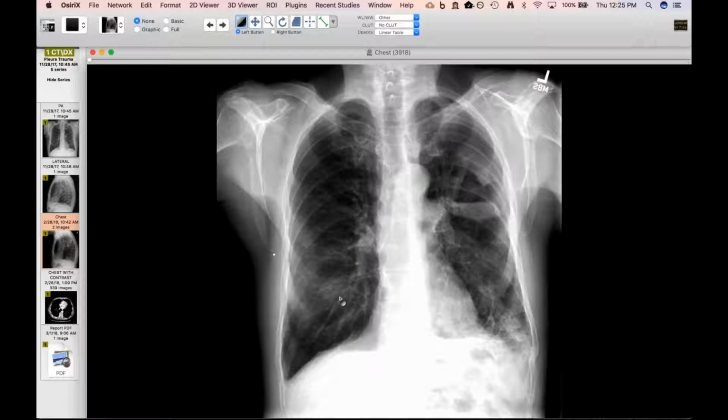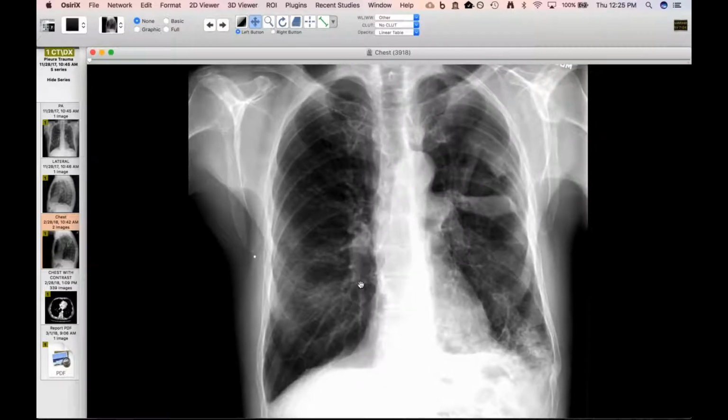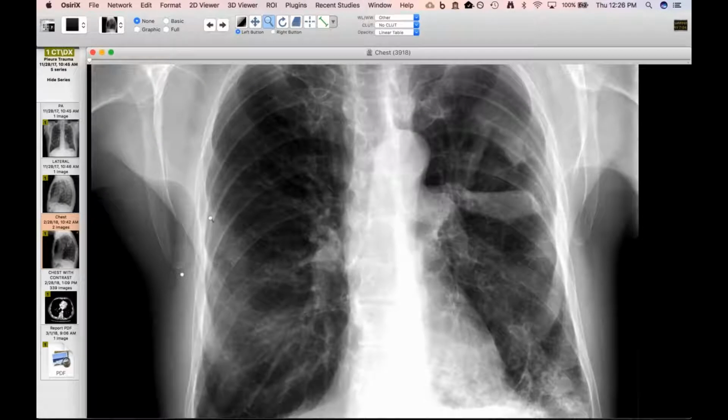Yes. All right, so some interesting stuff is coming in the last week. This is from yesterday here at the VA. This is a patient who came in, and this is not a gunshot or some sort of birdshot. This is actually a pain marker. So he came in with right-sided pain, and he does have a couple of rib fractures I'll show you on the subsequent CT, and there's a little subtle opacity, which corresponds to small hematomas.